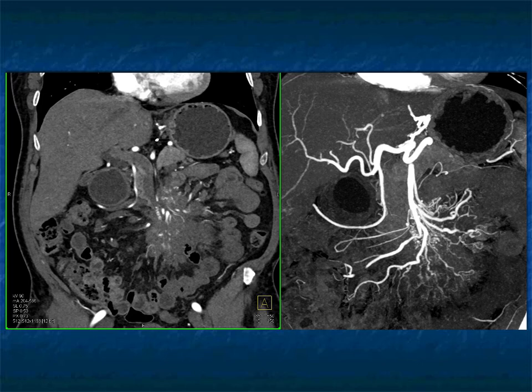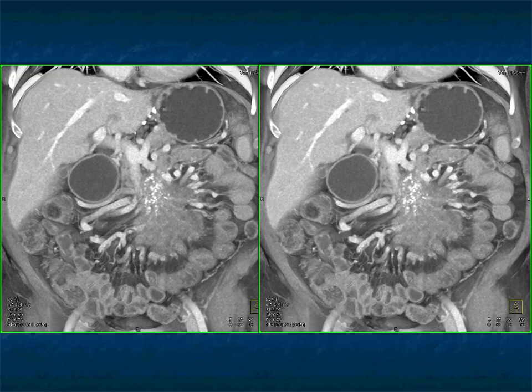Could be a carcinoid tumor with desmoplastic reaction. It could be sclerosing mesenteritis. Both of those have calcification, in this case does as well. Lymphoma usually is more discrete and infiltrates rather than causing the irregularity in the vessels, and lymphoma typically doesn't give that desmoplastic reaction. Here the vessels or the veins are being stretched.